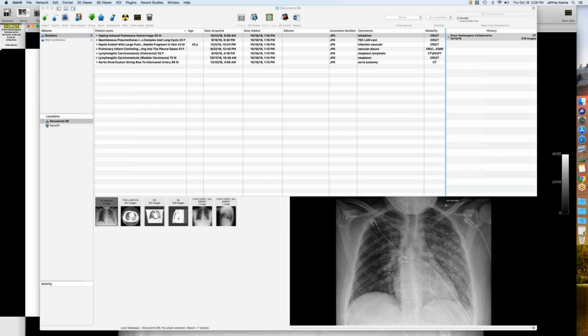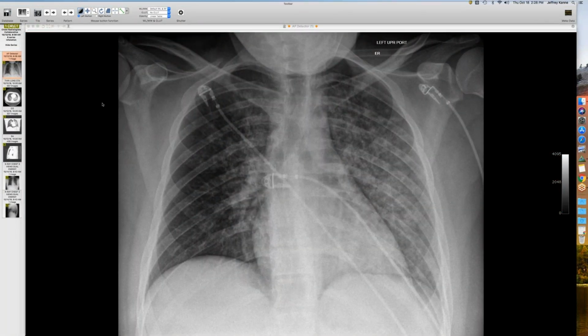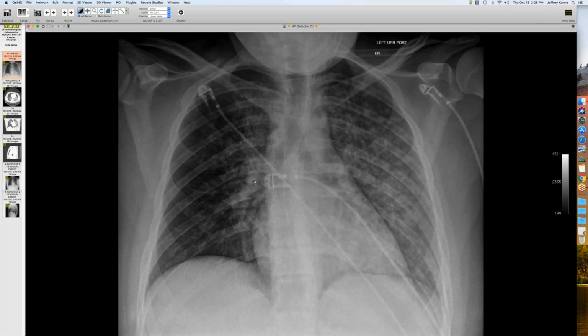So along our history of some of the cases we've shown of recreational type drug things, this is a young man who came in with shortness of breath and hemoptysis. And you look at the radiograph and you can see there's clearly nodules in this left lung and maybe a few on the right, maybe a good look for pulmonary hemorrhage with that history. But of course, infection would be pretty high on the list as well.